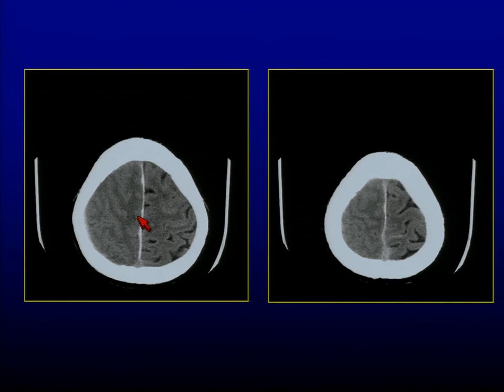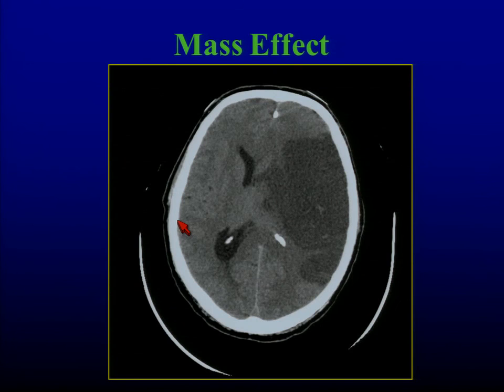And then moving up to the top cuts, only a couple times in my years of doing emergency medicine have I found problems only on the top cuts. But this was one of those patients. I was going through and their scan looked fine until I got to these last 2 cuts on the whole thing. And all I could say is that there's something going on this side that's not going on this side. There's a different gyral pattern. There's room on this side. It's tight on this side, but it wasn't causing midline shift. And this person had an infiltrative tumor that was infiltrating the brain but did not have a pressure phenomenon. So it hadn't pushed the falx over. It was just replacing brain with tumor. And so this was the look of it. I only found it on these last 2 cuts. Until we gave contrast, you wouldn't see it on any other cut.